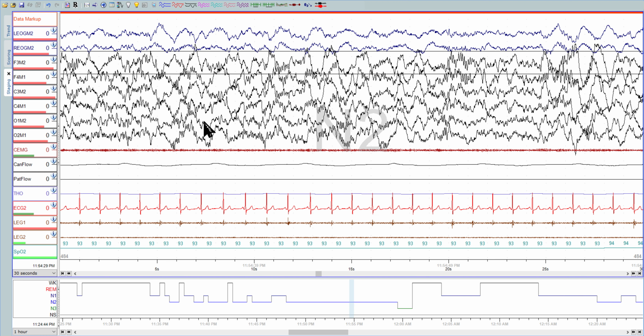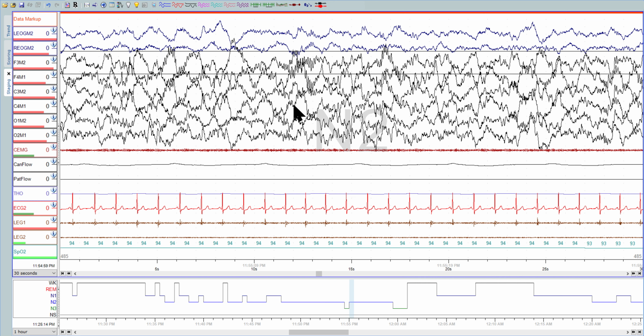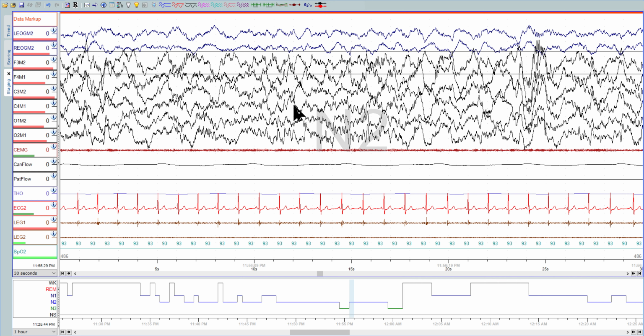I think I'd call 3 by here. You've got 1, 2, 3, 4, 5, 6, 7 delta waves. 7 delta waves. I'll just keep it in 3.